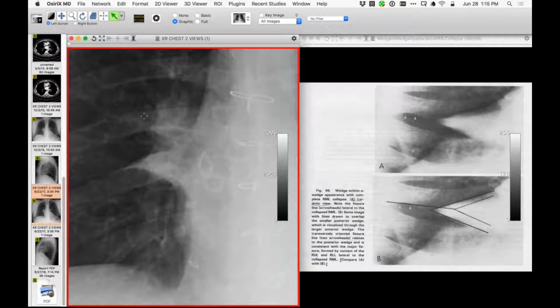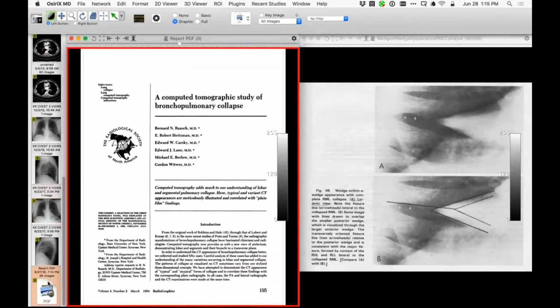So this is the middle lobe, right upper, right lower, where the right upper and the right lower meet, because here the right lower lobe is particularly expanded, making the fissure, which is the major fissure. So we have minor and we have major fissure.